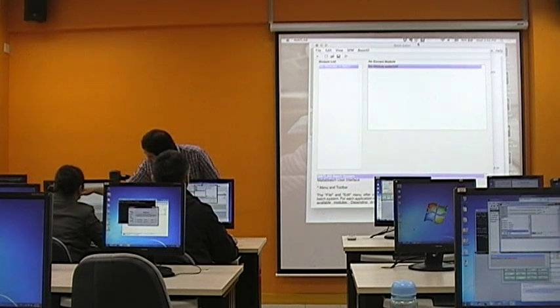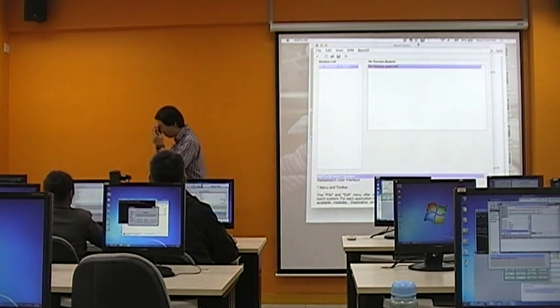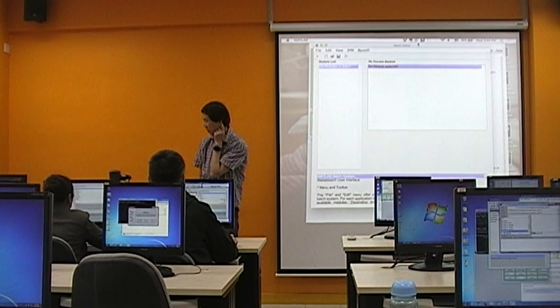Yeah, but here you have. So in data, you need to click new session. Yes, it's the same 270 files. Yeah. So after you click this, when you get like 3 different sessions, you could use dependency to get the input from the last step. Okay?